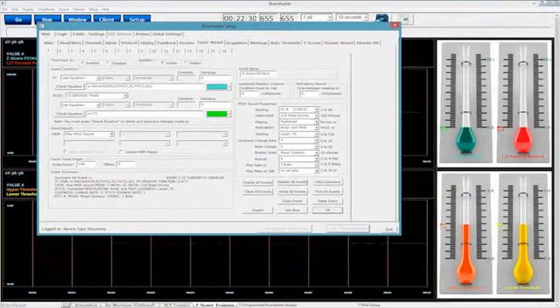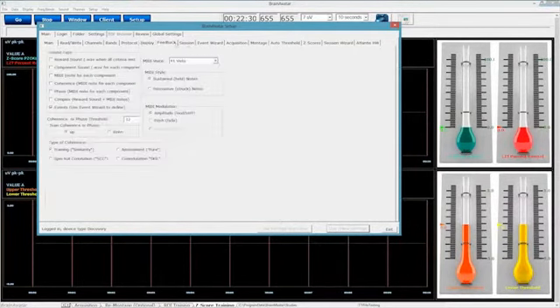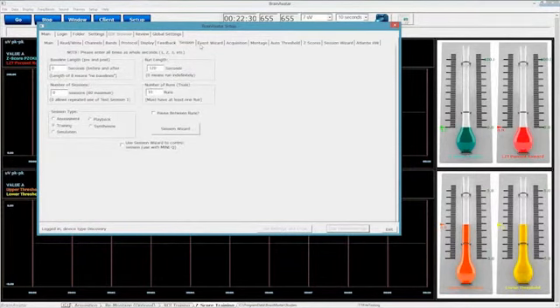The next portion you have right here is your sustained reward criterion and refractory period. That's another thing I forgot to show you that's a part of the original software.